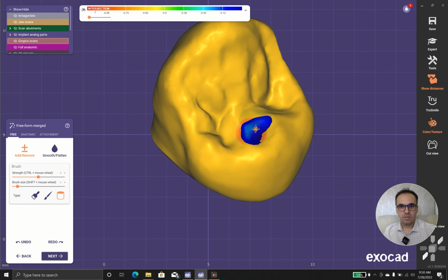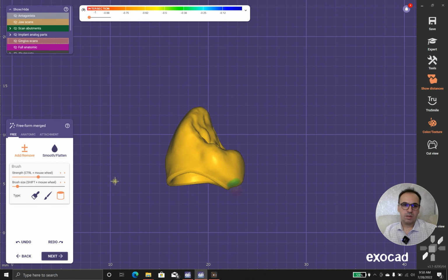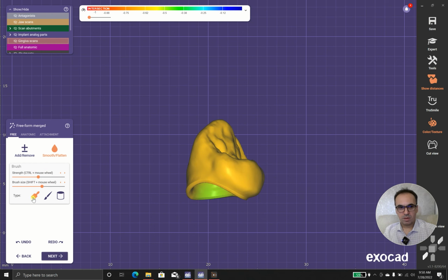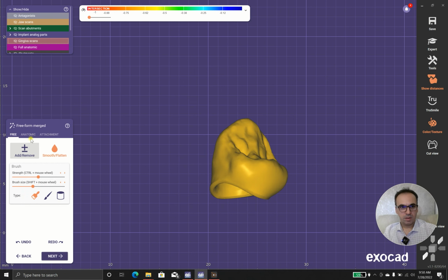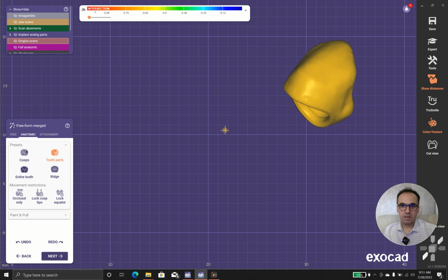In case we are lucky, we have enough space for that. But look over here, we shouldn't have such an angle, and it's better to form our teeth with a proper angle.